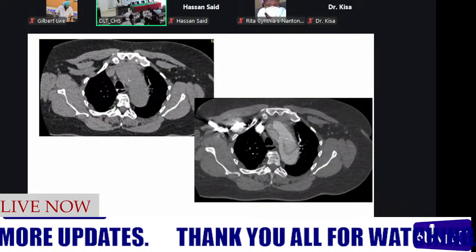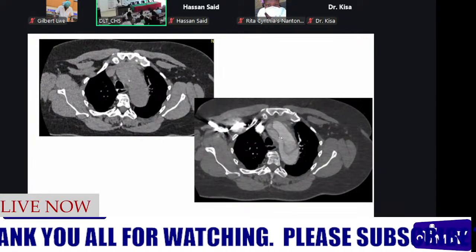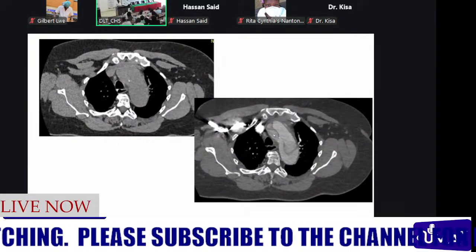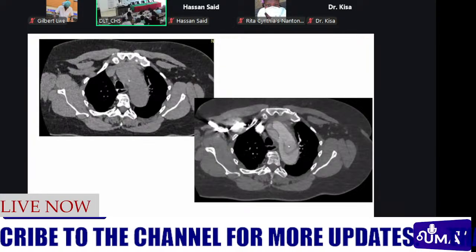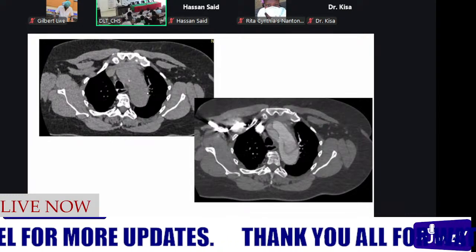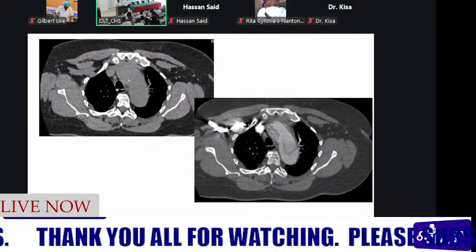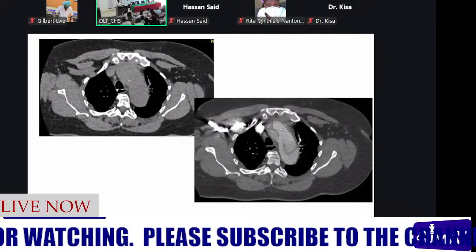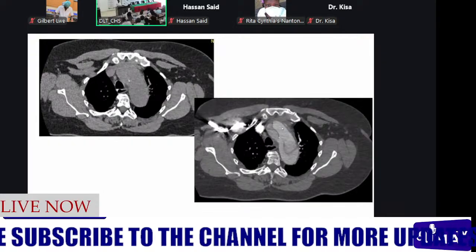So here we have our true lumen, which is surrounded by the false lumen on either side. This is where the tear actually happened, and it extended proximally up to the level of the aortic root, then also distally down to below the infrarenal portion of the abdominal aorta. So that's what we're able to appreciate. We see this linear hypodensity, which is separating our aortic arch into 2 lumens. We have the true lumen, which is brighter because it has active flow, so it enhances faster than the false lumen.